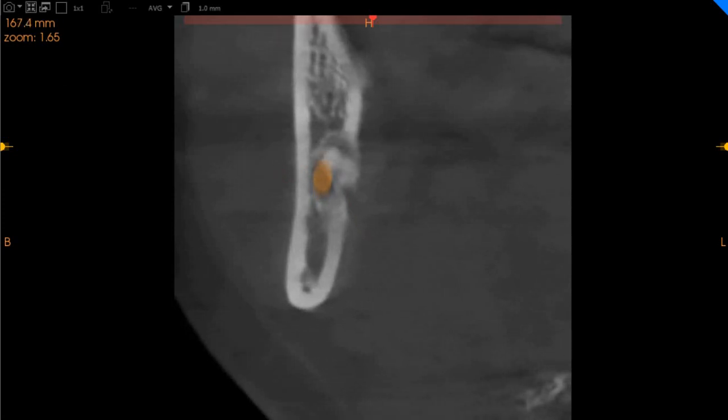And at this point, if we can remove the highlighting of the nerve, you can see at this point the rounded shape of the inferior alveolar canal becomes a little kidney bean shape right there. And this is where we can confirm that at this point the nerve is being compressed by the apex of the lower left wisdom tooth.